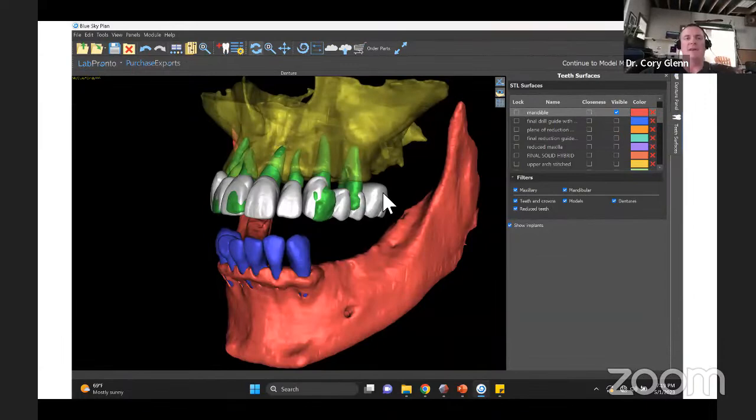What I'm going to do now is continually reference back and forth to that simulation photo. I didn't show an image of it, but one of the things you can do in that is turn the transparency of your simulation down about 50%, so that you can see here's my simulation of where I'd like the teeth to be, but underneath it, you can see their natural teeth and know, okay, here's where their teeth are.